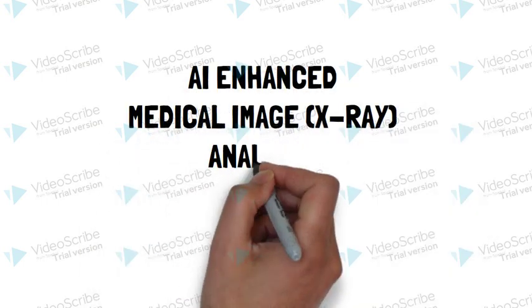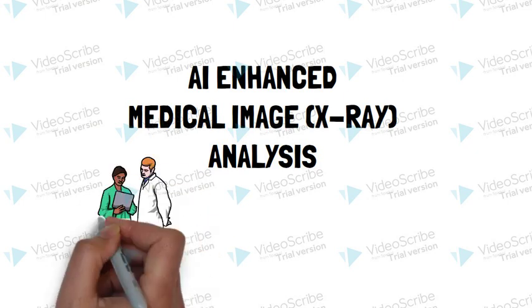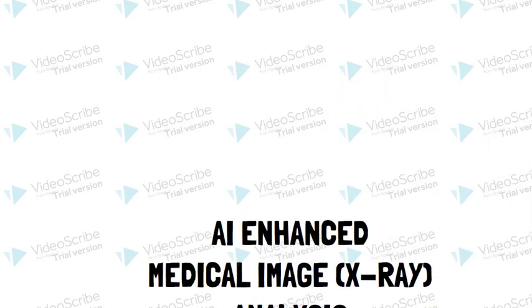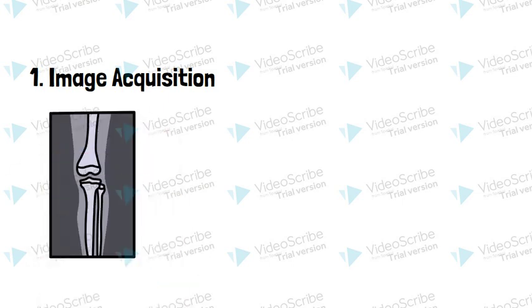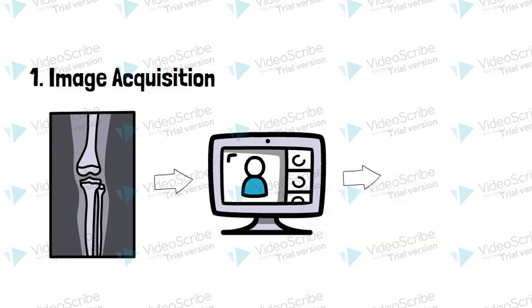AI-enhanced medical image analysis. This project aims to assist radiologists in accurately detecting anomalies in X-ray images using advanced AI technologies. We start by obtaining the soft copies of X-ray images from radiologists at a body scanning center. These images are uploaded through a web interactive platform built using Streamlit.